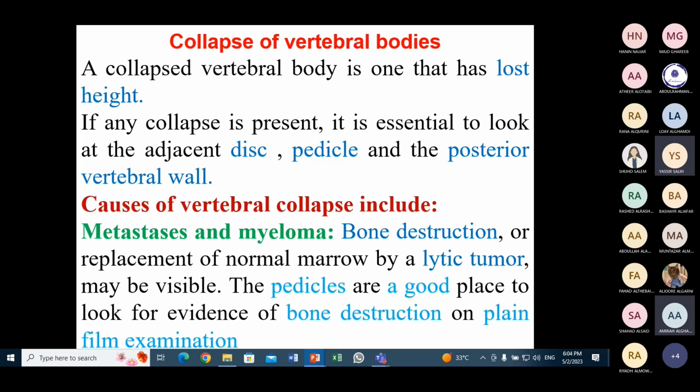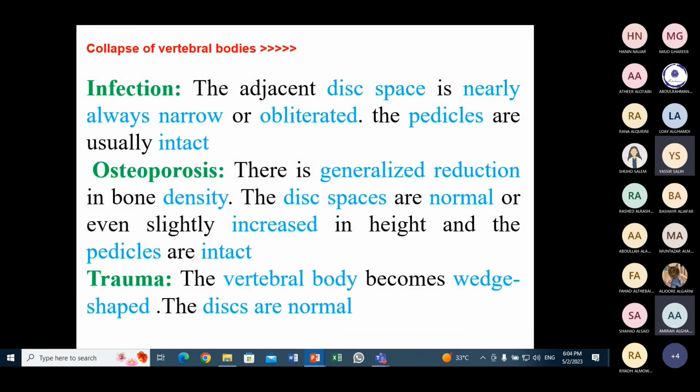So إذا دارين نعرف إنها هي metastasis or not نعرف إنه شنو بيكون عندنا destruction of the vertebral body يعني with lytic lesion, and this is lytic lesion mainly seen in the pedicles in case of metastasis. طيب نشوف الانفكشن هنتكلم وبعدك نوضح الساين دي على الايمج براكتيكال يعني.